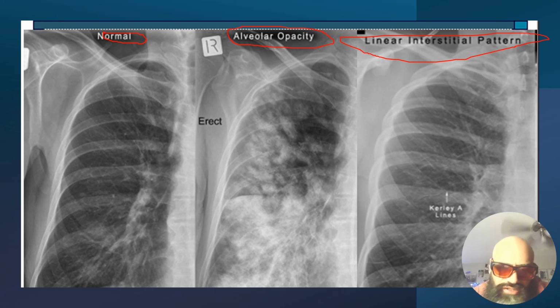Okay, so these are excellent to study off of and know the difference. Remember, understand normal anatomy first, then you'll be able to grasp a great idea of what has gone awry when you introduce fluid density over areas that should normally be filled with air density.